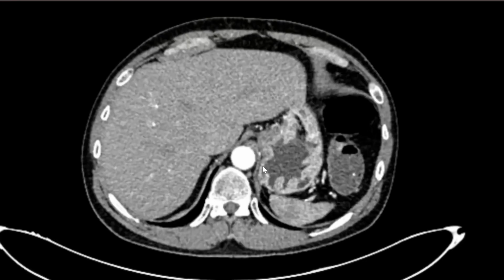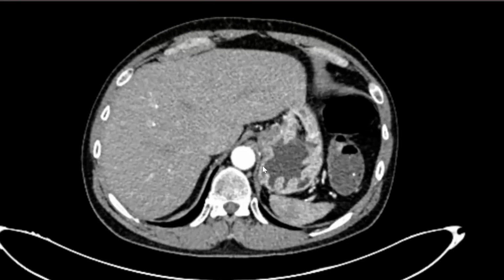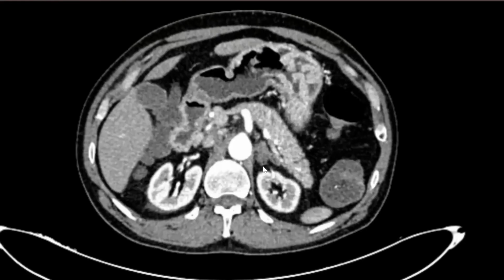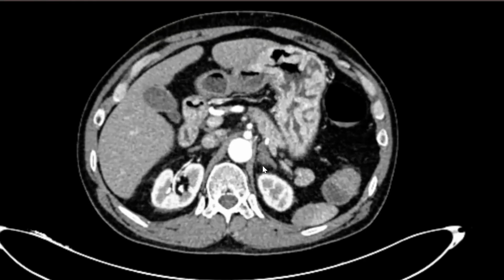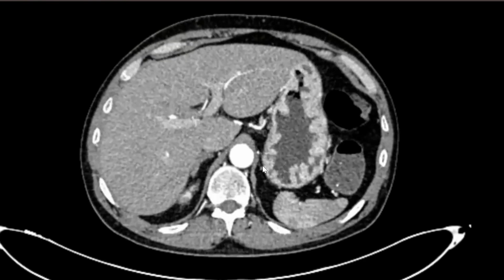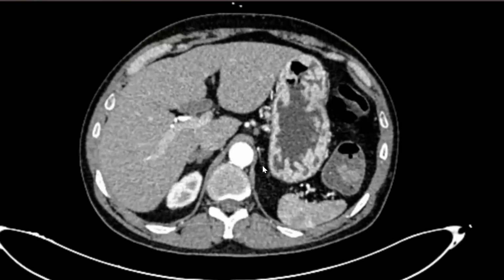Like in abdomen, your review areas mainly are the bowel and the edges of the film, right? So you should be quick to move to that, because the approximate time you took for this was around 10 minutes. And I tried to prompt you. Even then, I think you were not able to pick up, but that's fine. There will be cases where you're not. So just try to correlate with the history.